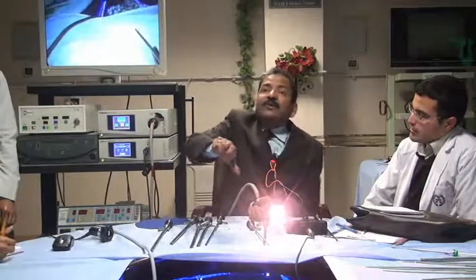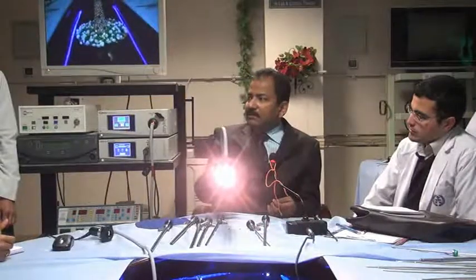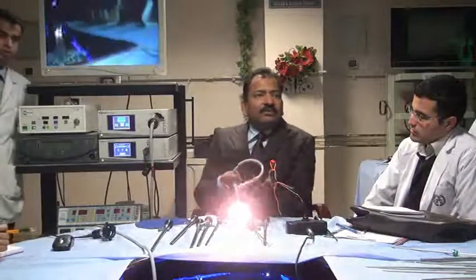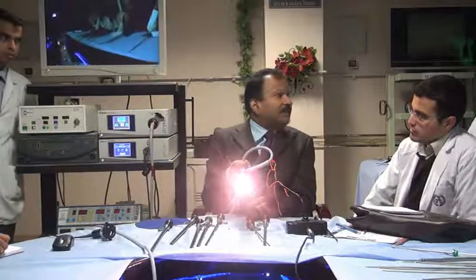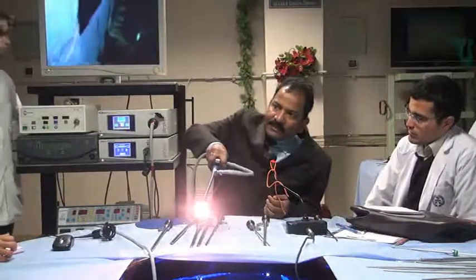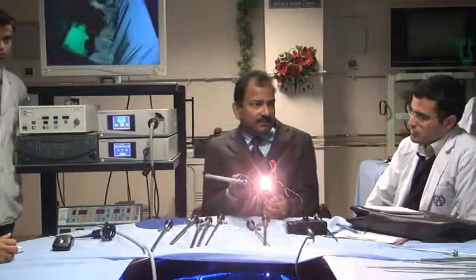For rotation you have to make some effort. If you hold it like that, you cannot go wrong. This is allowed, because rotating the telescope only changes the field of vision. It is not changing your orientation. Is it clear? If I rotate my entire hand, I am changing my orientation.